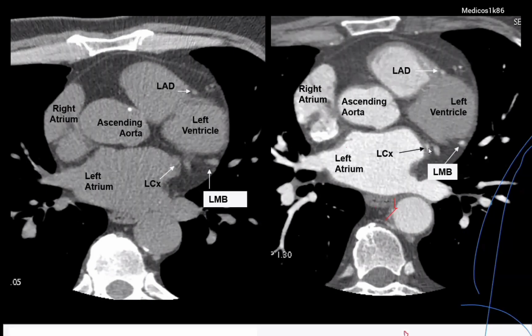And CX is still moving. And there is one more vessel. It is venous. It is not arteries. And the marginal branch here, LAD is here. And there is a very small myocardial bridging. And there is another small vessel. It is called the diagonal vessel, which is leaving from the LAD. LAD is the left anterior descending artery. Let me remind again. Okay, left marginal again. CX is here, but it's not easy to understand here where the CX is because there is no contrast.